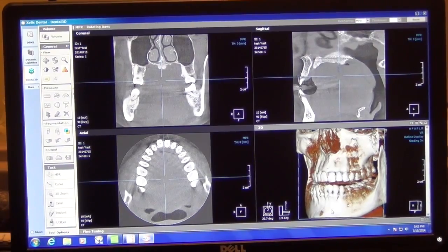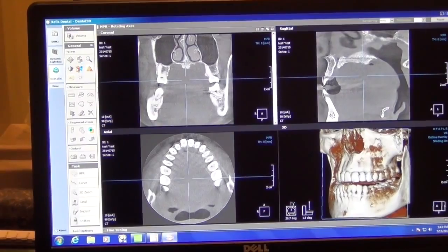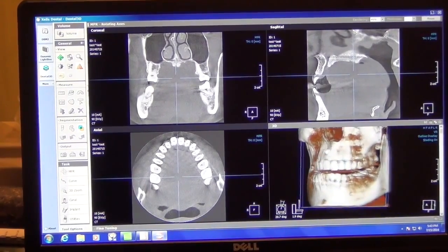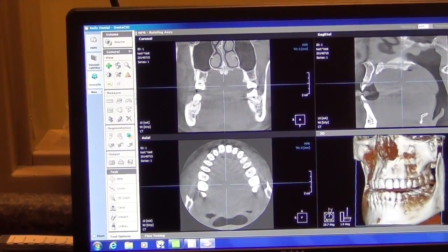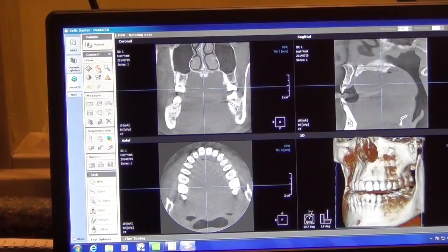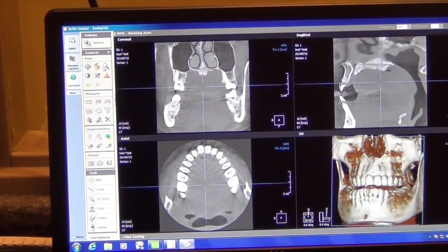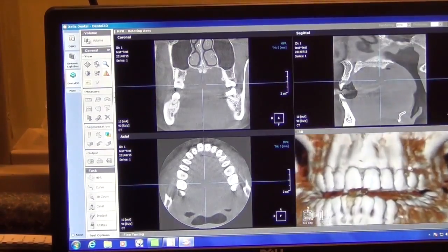Absolutely. So in the top left corner, we have them in different sections. The first section is basic view manipulation tools. So if I'm single left clicking on the icon here for pan, this allows me to move back over to the 3D reconstruction and just left click and drag and move the 3D representation wherever I want it to be. I can turn it off. Top left corner, I can also go to rotate. So doing a single left click on the 3D rendering will just rotate the image. I have the option to turn that back off. I can also do a zoom. Single left click, zooms in and out.